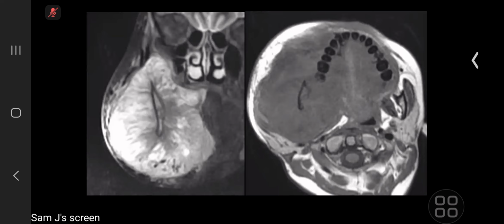It's not a cystic structure, so it's not a dentigerous cyst. I don't think it's arising from a nerve either. It looks like this is arising from the bone, especially because there's a periosteal reaction. Other sarcomas, like the patient's a little bit too old for a Ewing sarcoma, so I think that's less likely. And I don't think this is a metastasis. I've not seen a metastasis to the mandible before.